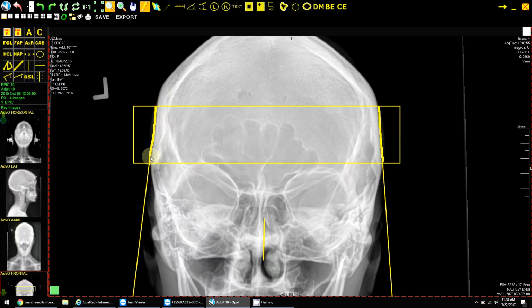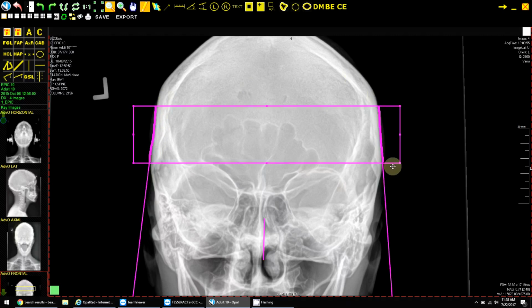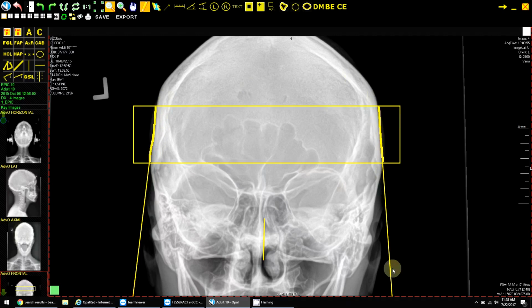It's just taking all these points, the trend line essentially, the slope of all those points, and then comparing that to all the points over here and creating that slope line. That's why you're seeing these lines coming all the way down this direction, because that's the average slope it's creating with that contrast. Mathematically, it's extremely simple.